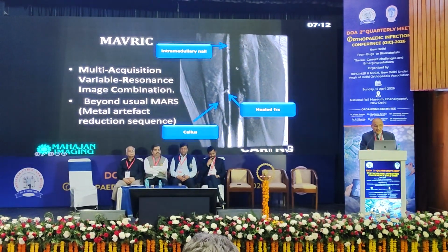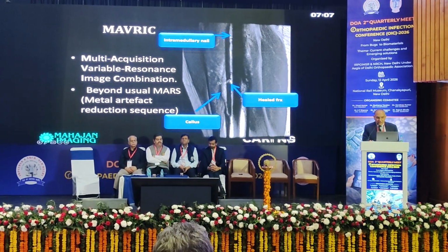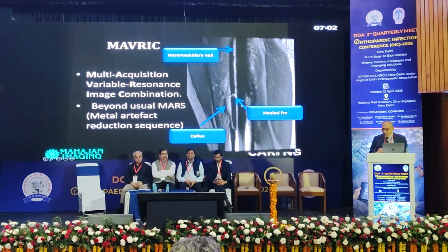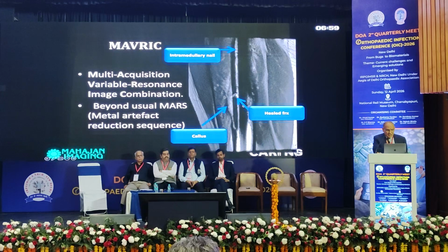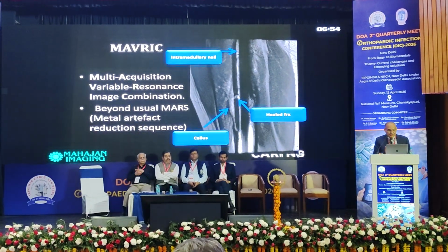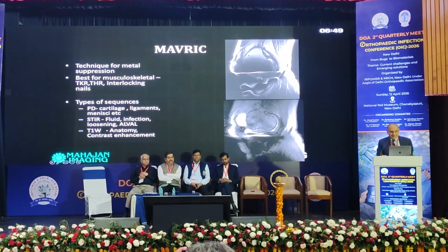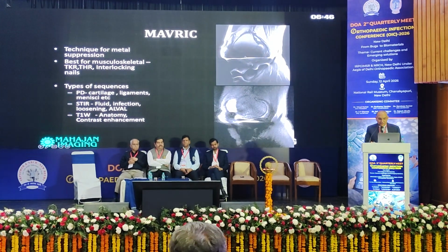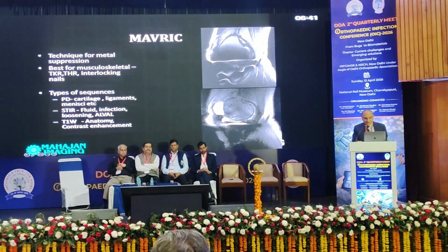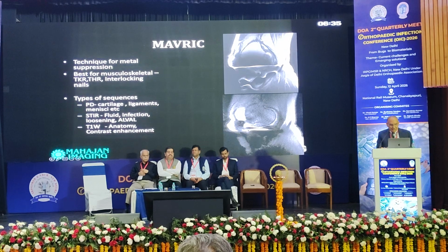In fact, this is an intramedullary nail, and this we did just to show that even the callus that is formed in this fracture can be seen very well. You can suppress the artifact to that extent. And this is, for those who may be interested, multi-acquisition variable resonance image combination, and this goes beyond MARS, as we can see. This is a standard MARS sequence, and that's MAVRIC with everything you're able to see in this case. The bones, the intra-articular structures, the fusion, all of that seen very well.